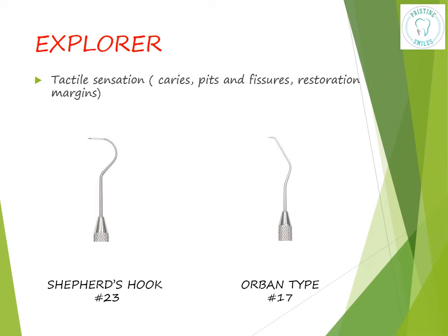Other types of explorers include the pigtail or the cowhorn explorer, number 11/12 type explorer, and the straight explorer.